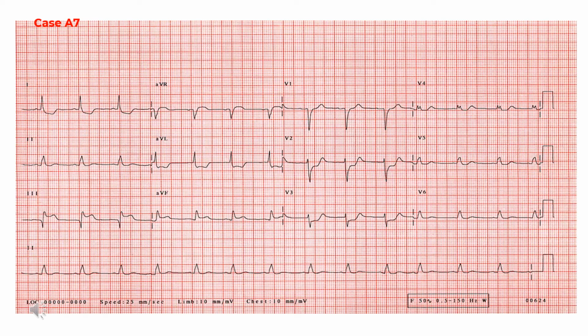The appearances of the ST segments should be carefully studied. The changes in leads V2, V3 and V4 show the horizontal depression often seen in acute ischemia. Leads I and AVL show downsloping ST segments. Compare this ECG with the previous example, which showed infarction and corresponding reciprocal changes in the opposite ventricular walls to this one. Old anterolateral infarction is also suggested by the loss of R wave in this ECG.